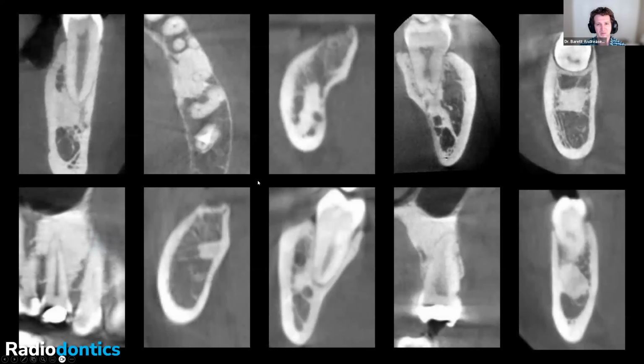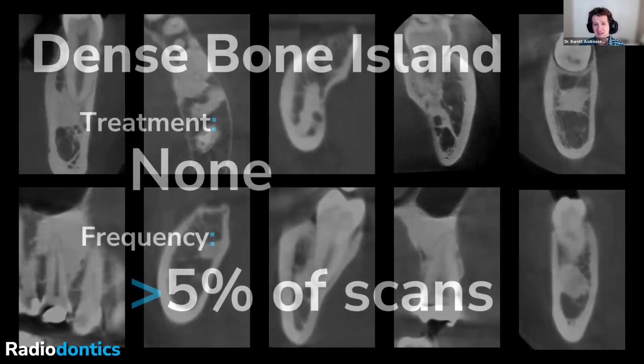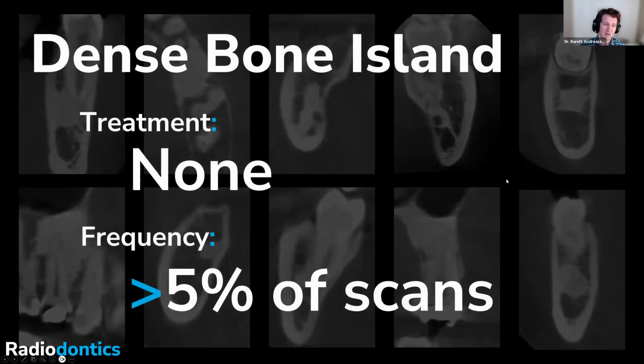And while traditionally they have a more circular appearance, they can really be completely amorphous. So they don't have to have a nice round shape. They can be kind of sporadic, but we're always looking for those defining features of where they meet the cortices, they just blend into that adjacent cortex. They're generally very homogeneous in appearance. They aren't granular. They're very radiopaque and just that one shade of white. Really no issues here with these patients. Again, they are normal anatomical variations, so we're not biopsying, we're not treating. Patients shouldn't have any symptoms.